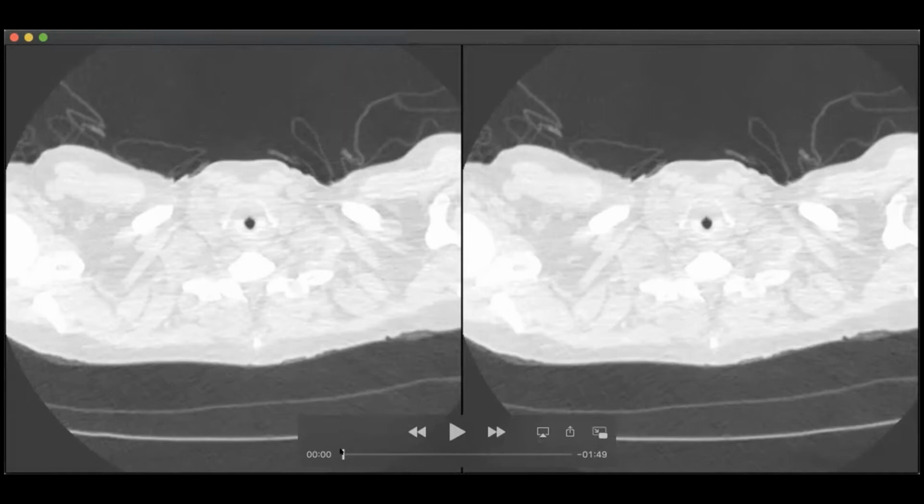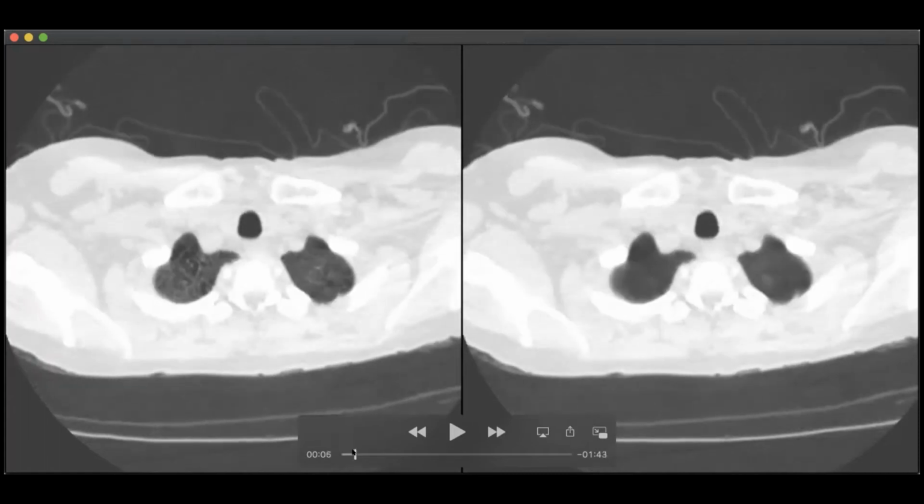The patient then had a short-term follow-up for other reasons. And at that point, we had implemented the vessel suppressed algorithm. And it just struck me as to how easy it is to miss something. So I'm just going to play through this as we go along.